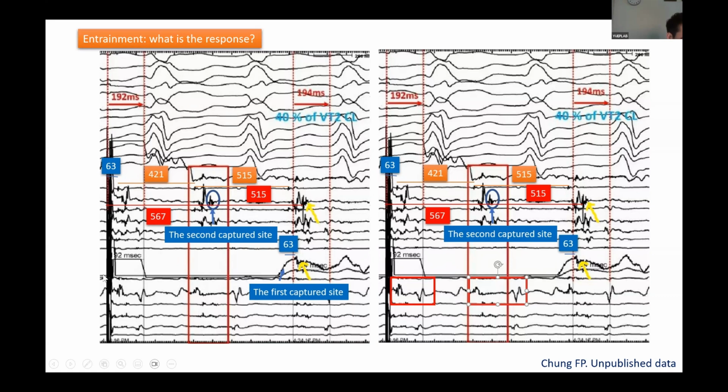The behavior is totally different from the local electrograms. What happened to this one is that when we have high density mapping, you have more chance to understand the very complex architectures. So sometimes you have multiple site capture. We also capture adjacent bystander given a very high current pacing. So part of the electrogram will be the adjacent bystander, so it needs a longer time to return back to the site where we recorded the adjacent bystander signals.